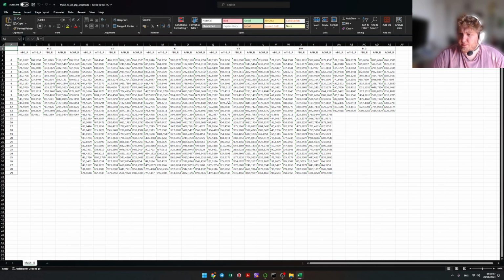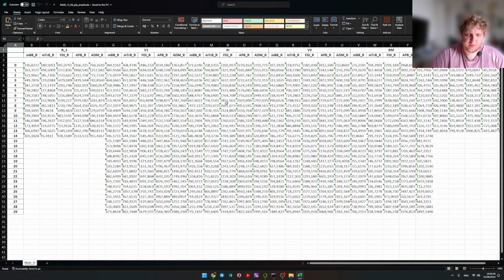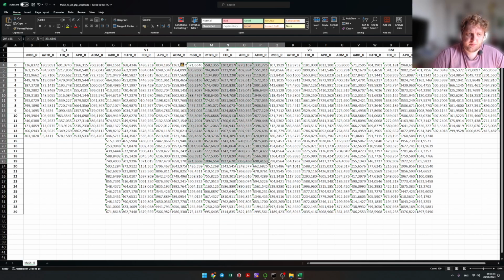So this is how our data looks in Excel. I was asked to change the dots to commas, and this is the reason why there is a problem with dots in the peaks, but still, this is our data. You could use it, obviously. Here are the values, not from 1 but from 0, but it's okay, it's 15 of them. And all the values, I compared them to the Pavel script, and all is working well.